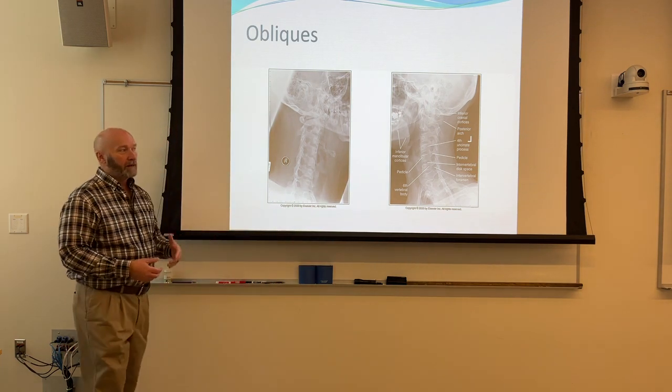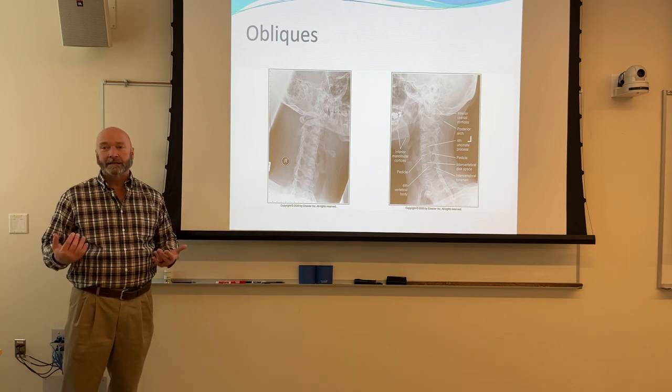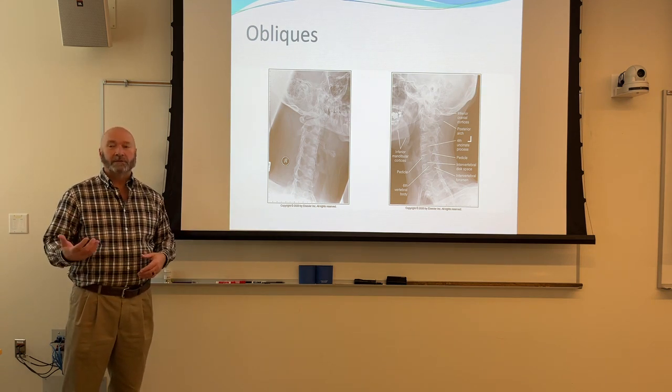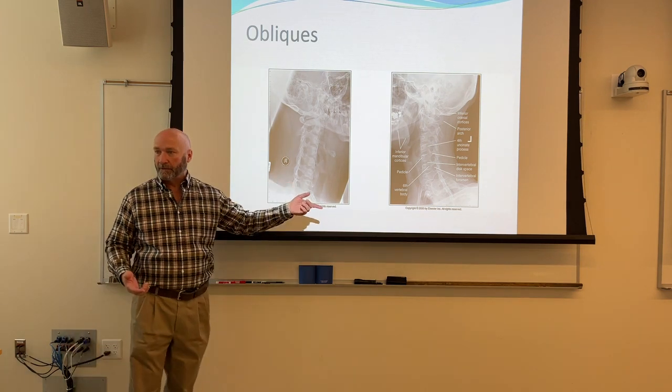Okay. So I have worked in a hospital where that was protocol. If you could not, swimmers wasn't a thing. I said, I want a swimmers. Just don't send me that. If you can't get down to C7-T1, trauma obliques is what you had to do.